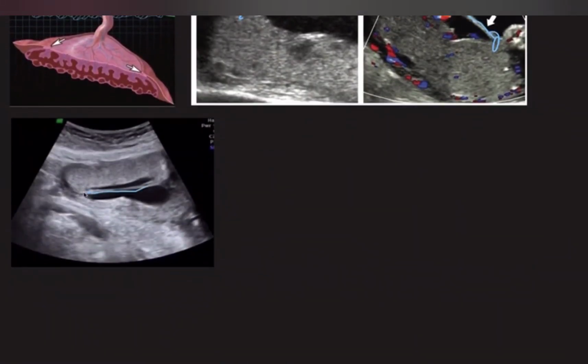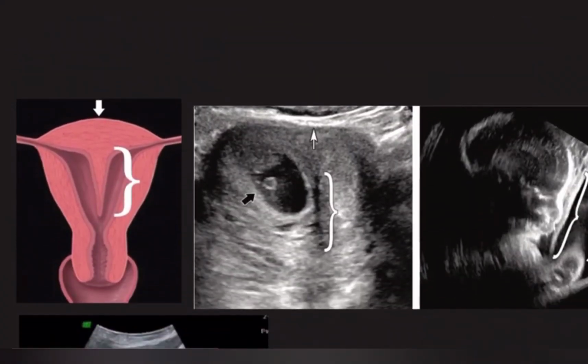So see, this is actually the circumvallate placenta, where we can see the rolled edges of placenta, and the orientation of this membrane is parallel. Okay, now the fourth differential is actually the uterine septums, the duplication anomalies of uterus, like in septate uterus or in bicornuate uterus. Like for example, in this septate uterus, we can see a thick septum. So where they will attach.